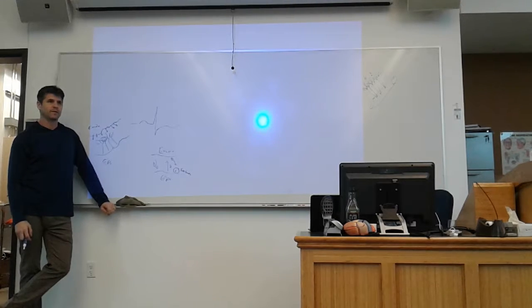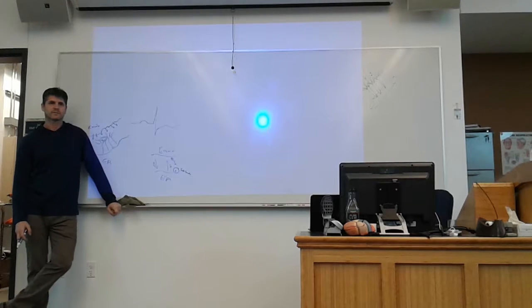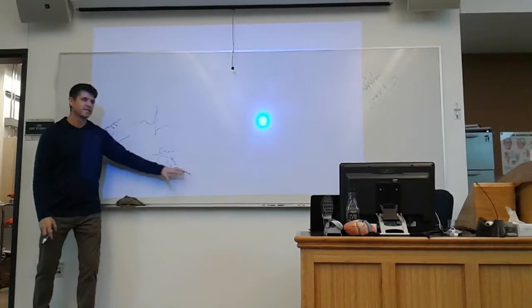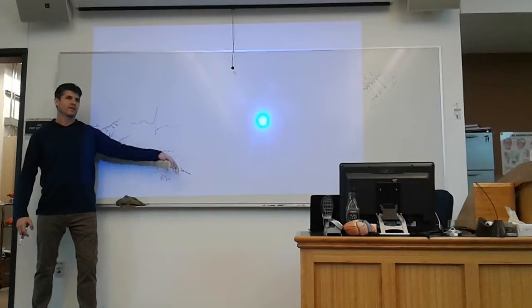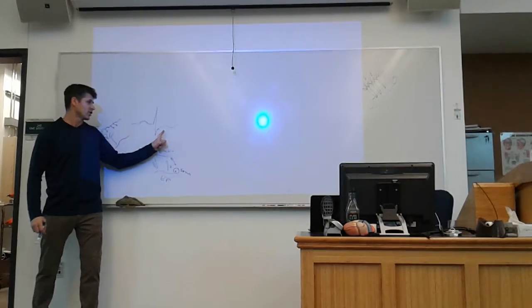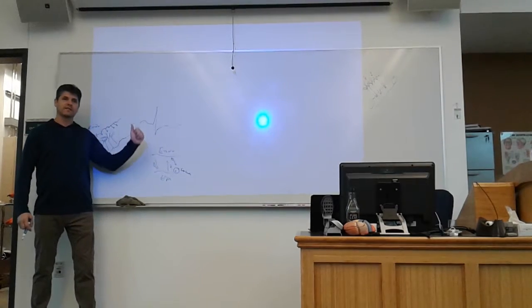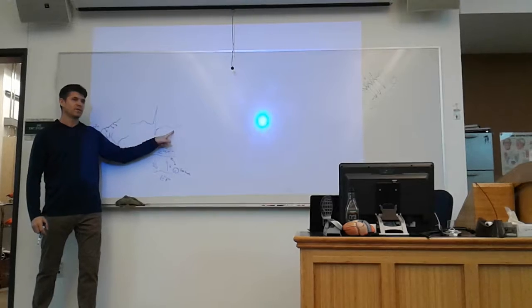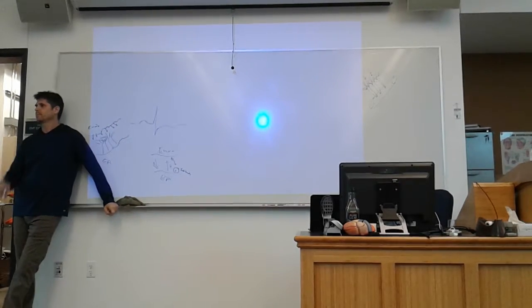Hence the flip T wave and the depressed ST segment. The depressed ST segment, because this tissue is staying in the negative hyperpolarization time longer, and the flip T wave, because it takes a different pathway for repolarization than we are used to, until it gets back to normal.